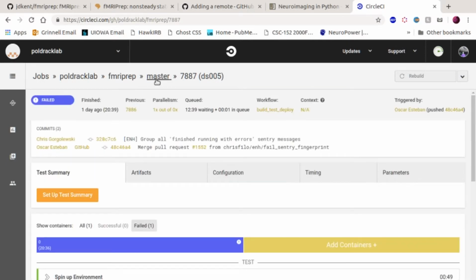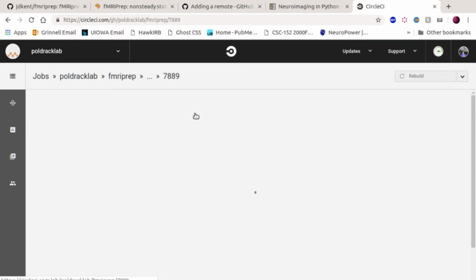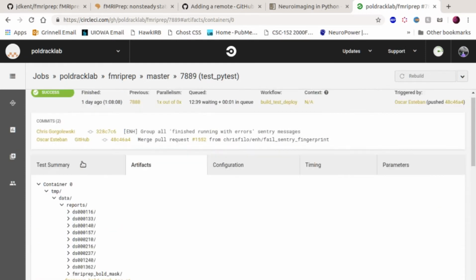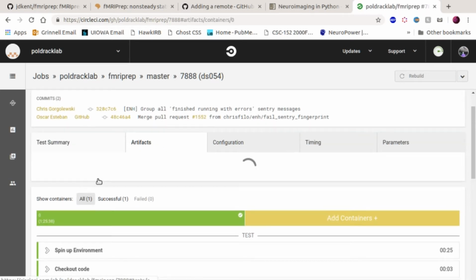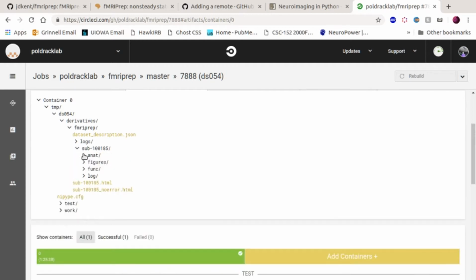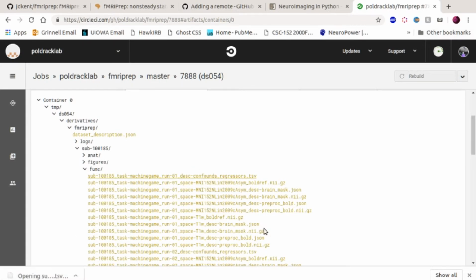Alright. Maybe not much. Okay. Oh, alright, what's this? Oh, test. Guess I want an actual data set. Maybe it fits in the context of my test. This doesn't detect any non-steady state volume, I think.